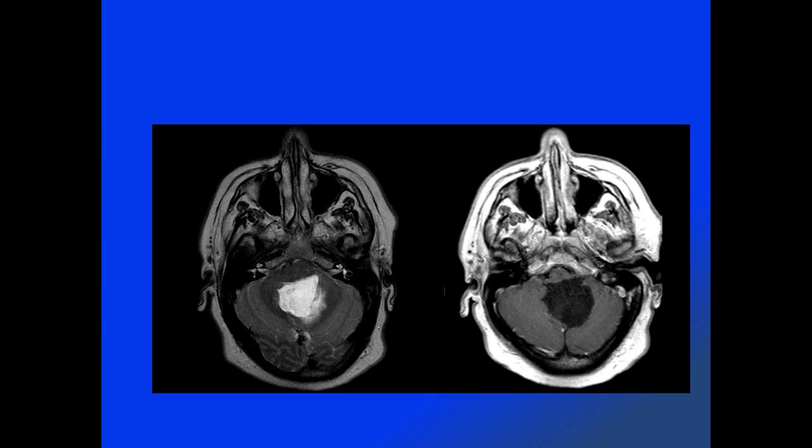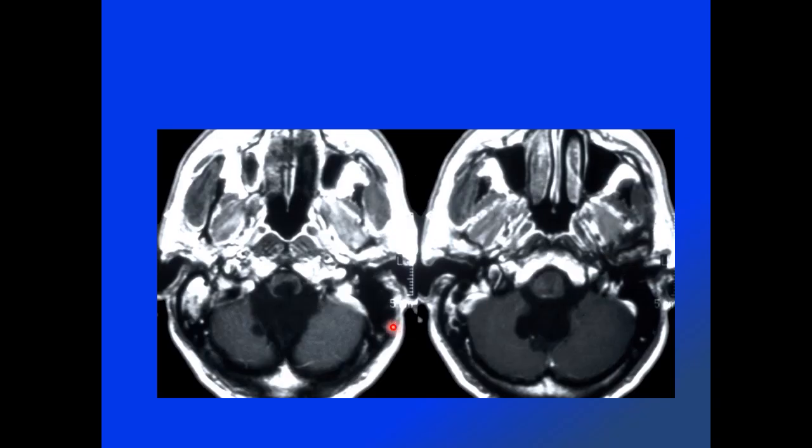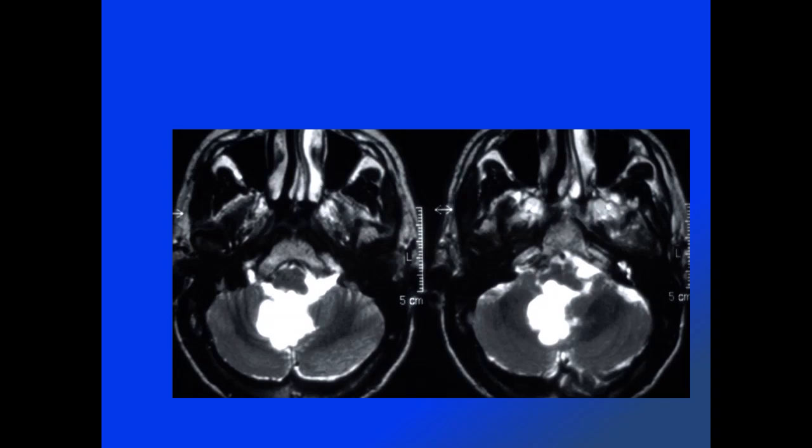In a different patient, there's also a hypointense mass on T1 weighted image, which extends out through foramen of Luschka bilaterally on these T1 weighted axial images, with prominent hyperintensity on T2 weighted images similar to the signal of CSF.